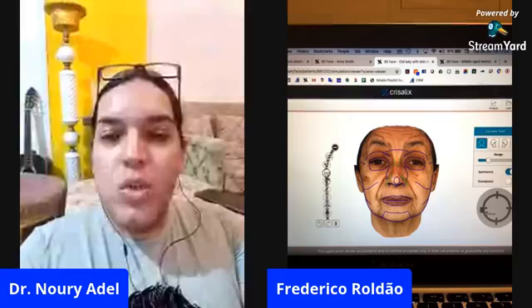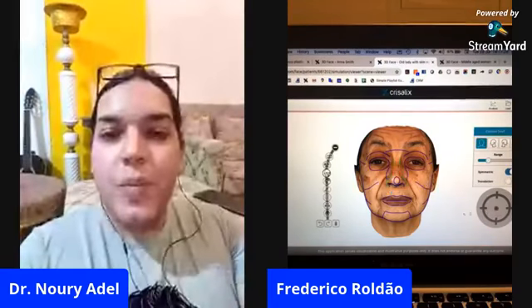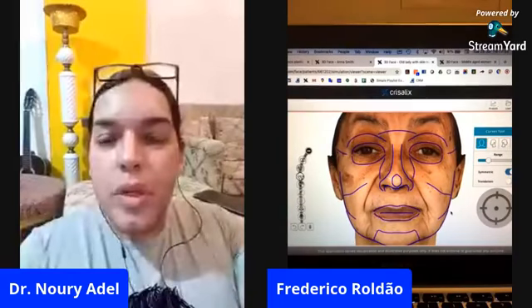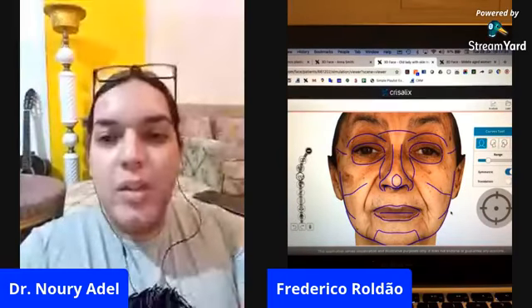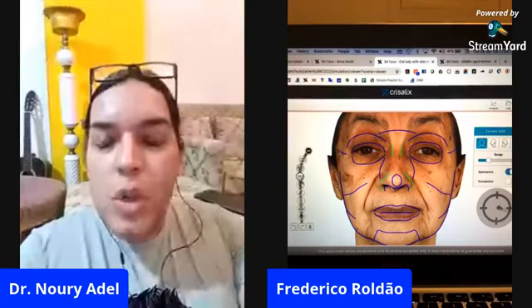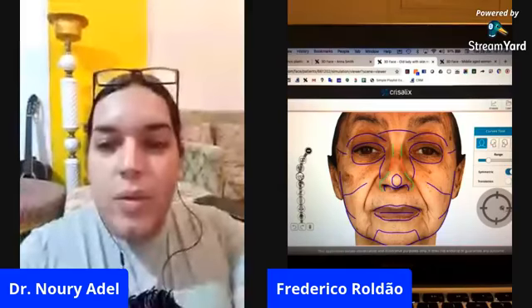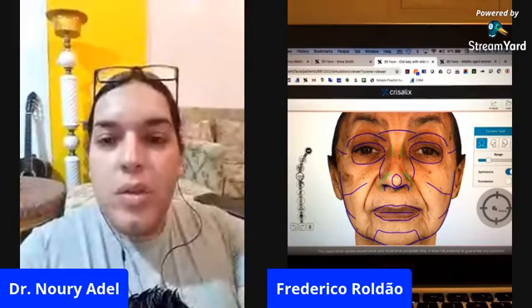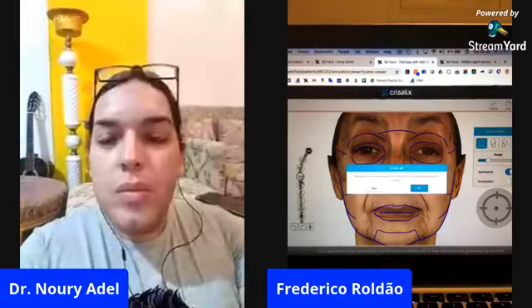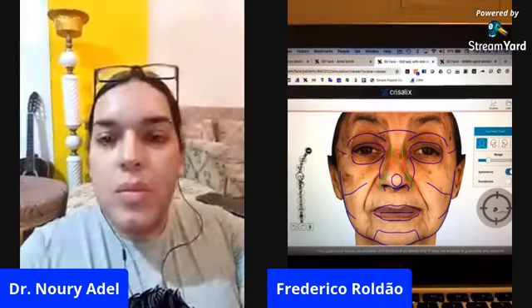Yeah, but as I told you, the screen is a little bit far. If you can zoom in, it will be much better. Okay, let me try to zoom in a bit more. Is this better now? Yeah, this is better. So you are manipulating the bridge of her nose. Exactly, yeah. So I just did some changes there. I will delete them. Okay, that's her back to normal. So I will narrow the bridge a bit.